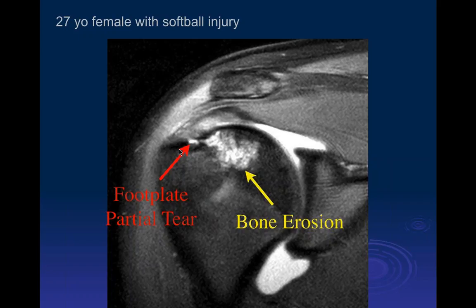Okay. So this is pretty common. There are three causes. This is a little bit more anterior than typical, but these signal abnormalities typically are more prominent posteriorly than they are in the mid portion of the head. They typically are primarily at the insertion of the infraspinatus tendon. There are three primary causes of that. I think we've talked about this before.